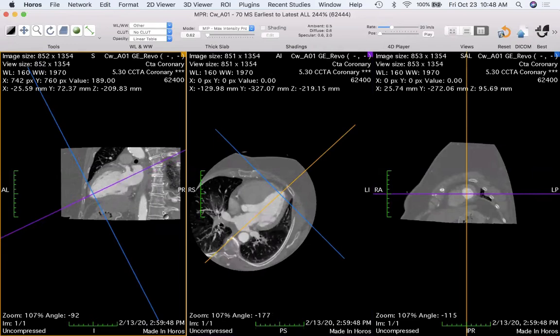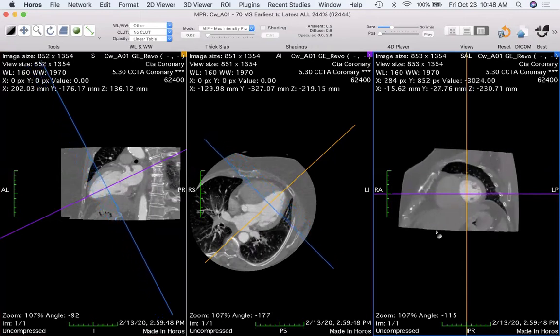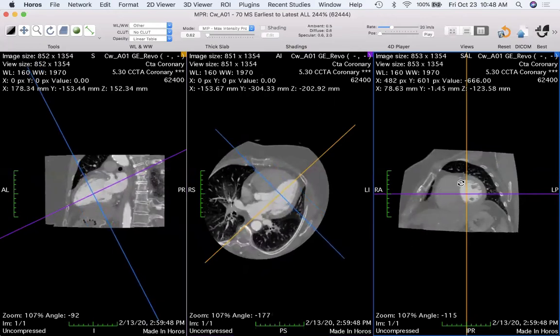And that gives me the classic views of the left ventricle. When I now go here, I use two fingers once again in order to page through the views inside this window. It moves the cursors over here. And so this view is called the mid level. So it's halfway through the heart. This is a short axis view. This is called a four-chamber view because you have the left ventricle, the right ventricle, the bit of the right atrium and the left atrium all in one view. And this is called a two-chamber view because you have the left ventricle and the left atrium in that view.